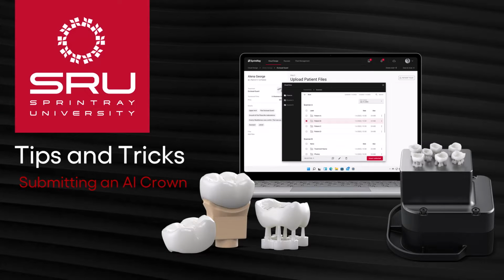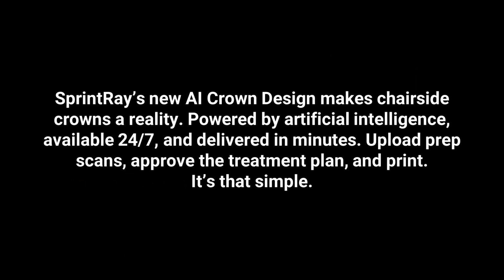Today we will be performing a walkthrough of submitting an AI crown and the best tips for success. SprintRay's new AI crown design makes chairside crowns a reality, powered by artificial intelligence, available 24/7, and delivered in minutes. Upload prep scans, approve the treatment plan, and print. It's that simple.